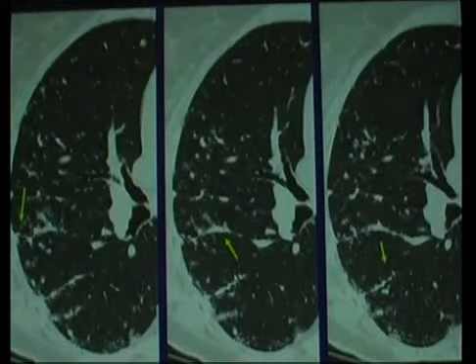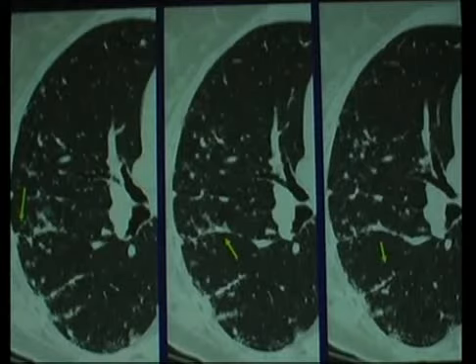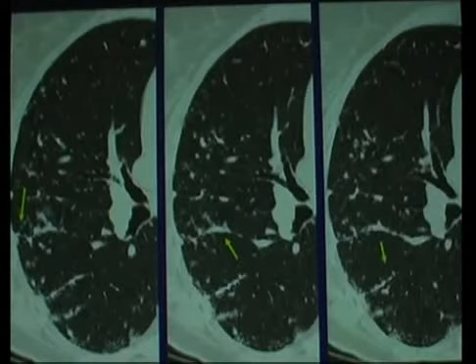Because that's where the granulomas are. Classic appearance of sarcoid. Notice that, in fact, they're clustered, they're tiny, they're poorly defined. There are whole portions of the lung that are not involved. Sarcoid tends to be a very scattergun kind of thing.